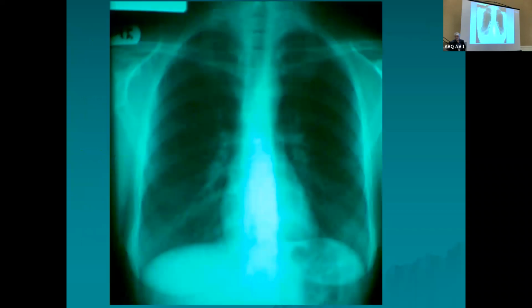Now looking at the lungs. When we look at the lungs right here, we want to look at the trachea. Should come down. We may be able to see it bifurcate right out through there, through the bifurcation. We want to look at the perihilar area right through here. And then we want to extend from the bronchi to the perihilar area. Now in here, you'll notice that it looks like there's some buildup right here, but that's actually tissue of the lungs, tissue of the cardiac right through there, and the different buildup of tissues. That's not really pathology that's present.